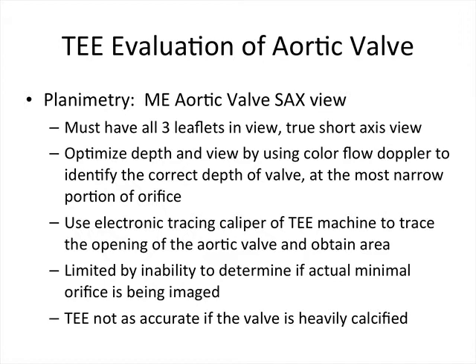The use of planimetry is limited by the inability to determine if the actual minimal orifice is being imaged, and TEE is not as accurate if the valve is heavily calcified, which is normally the case with severe aortic stenosis. Some studies have shown that planimetry of the aortic valve area compares favorably with measurements of aortic valve area obtained by cardiac catheterization.